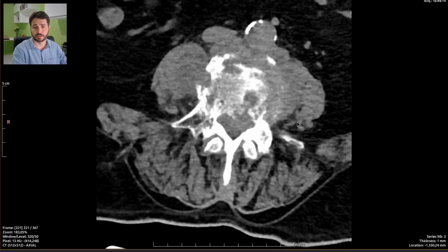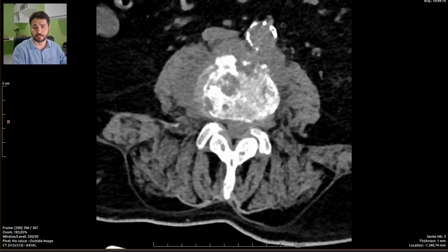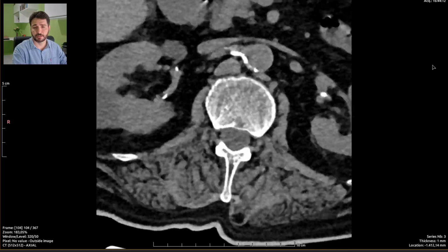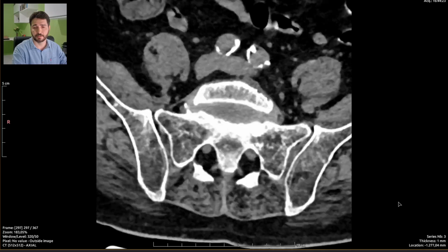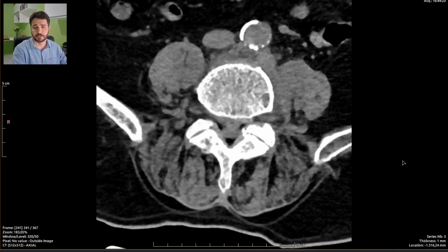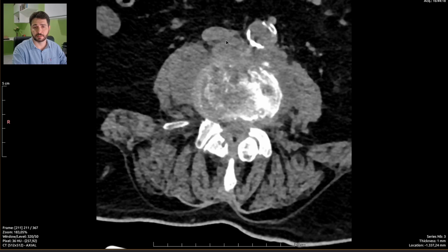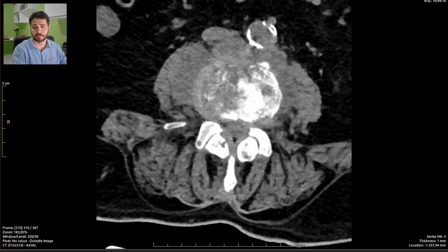Oh, there is something very ugly right here. Could be an acute fracture, could be an osteolytic lesion secondary to something else. This clearly isn't an easy exam. There seems to be some soft tissue extension of this fracture to adjacent structures and to the vertebral canal.